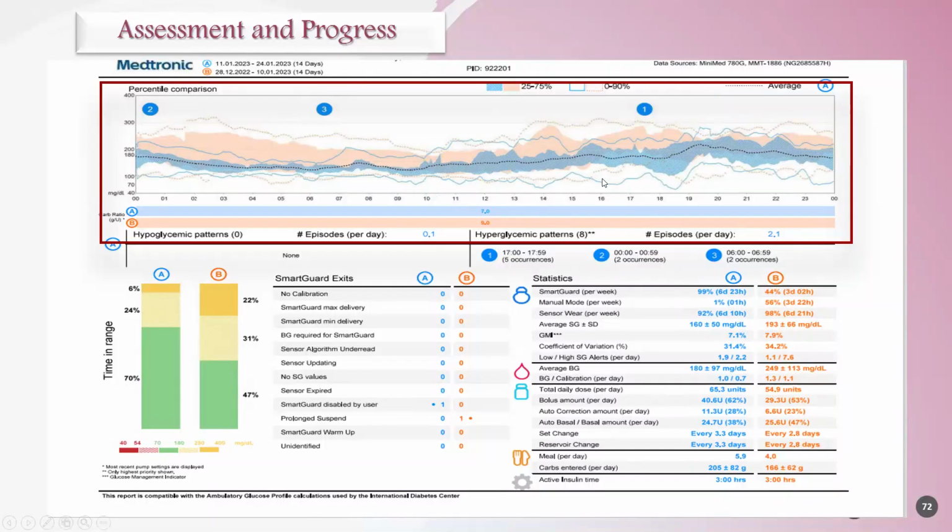So there is another nice thing, and I use it, this number, if you tap on this downward button. It tells you about the hyperglycemia or hypoglycemia only in the last 2 weeks segment, only on segment A. It's very nice to look over it because it will summarize for you what happens in the curve quickly, at a glance.